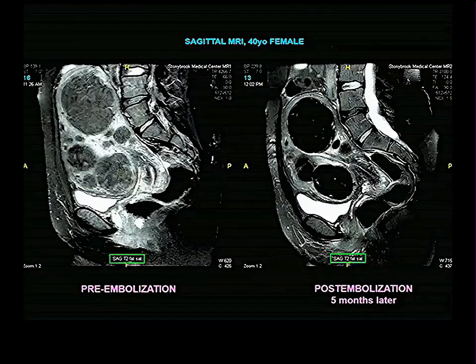Here is a person with lots of uterine fibroids, lots of them. Here is the treatment. I think the treatment's discussed in clinical sidelights, one of the treatments. When you have this many uterine fibroids, it really does cause pain and dysmenorrhea and things of that nature. So they try and get them down in size. They should just do hysterectomies for women like this.